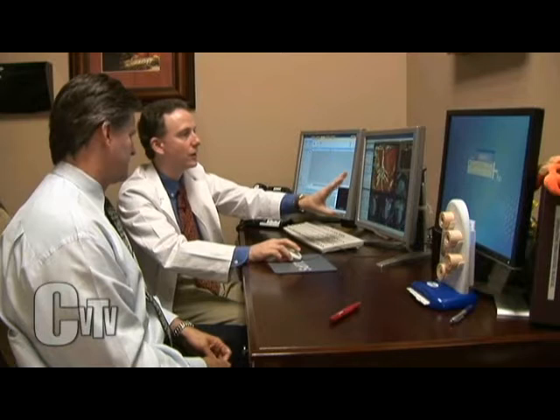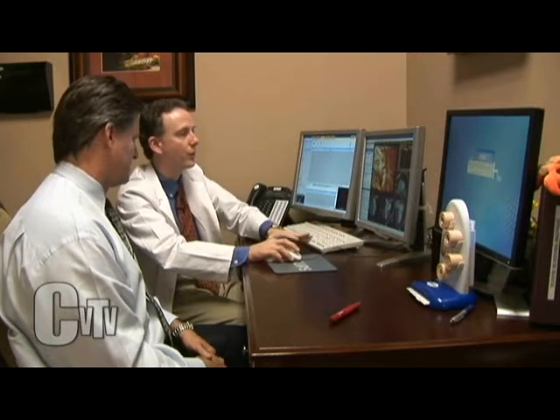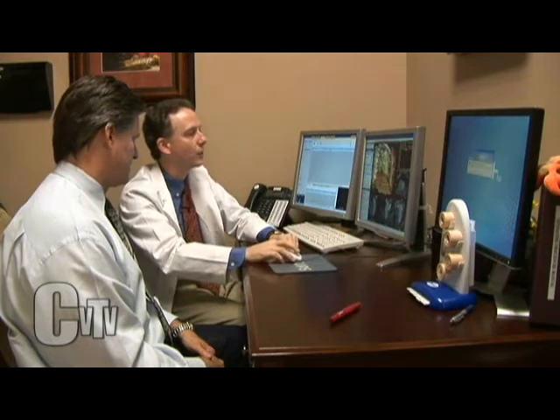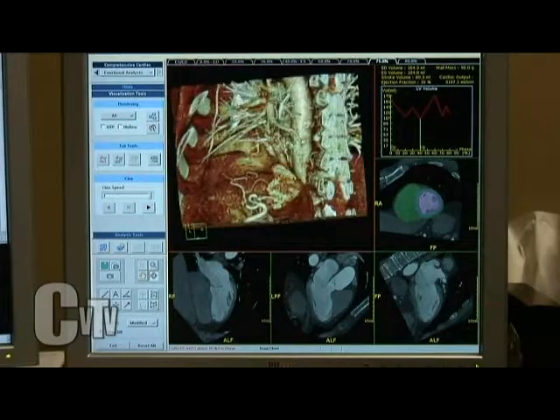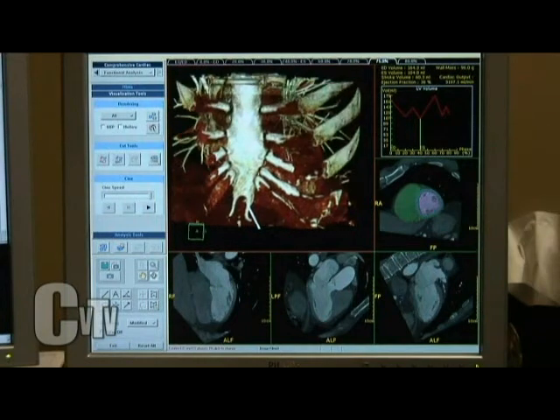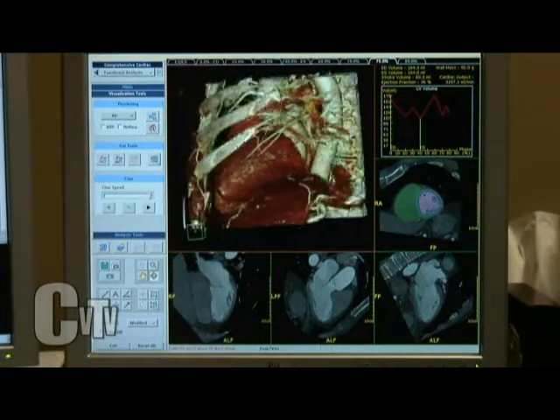So we do the coronary tree, and that's what it looks like, and we can spin it around. Lastly, we can actually take all this three-dimensional information and put it all back, because before we just pulled the heart out, now we can add everything back. So here what we're looking at is the entire scan. So there's the breastbone here. Yep. There's the ribs. There's the heart.